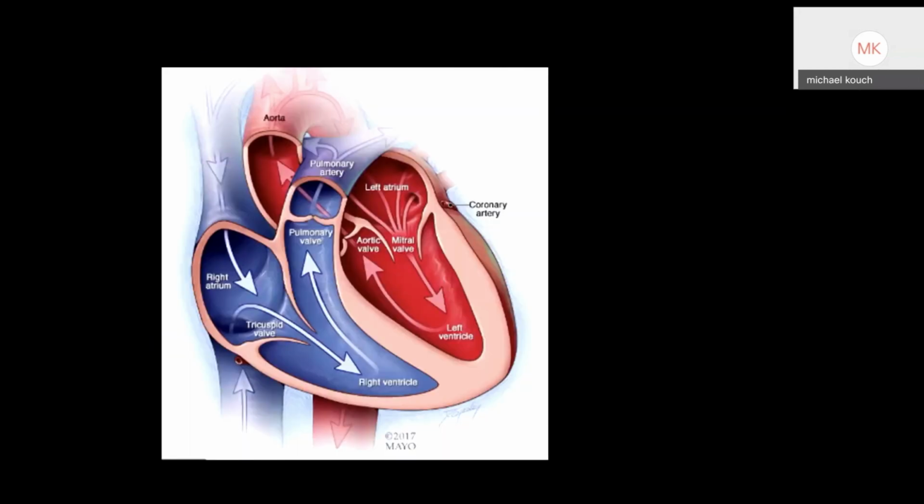So you can look at a lot of separate things using M mode. You can look at your mitral valve like we just spoke about. You can look at your aortic valve and aortic outflow tract. We can look at the left ventricle as a whole. We can look at the right ventricle and specifically its systolic function, which we'll talk about in later lectures. And you can look at the pericardium. And we're going to go through examples of all of these. I'm going to move relatively quickly so we can get through our questions. And then you can go through and look at these later.